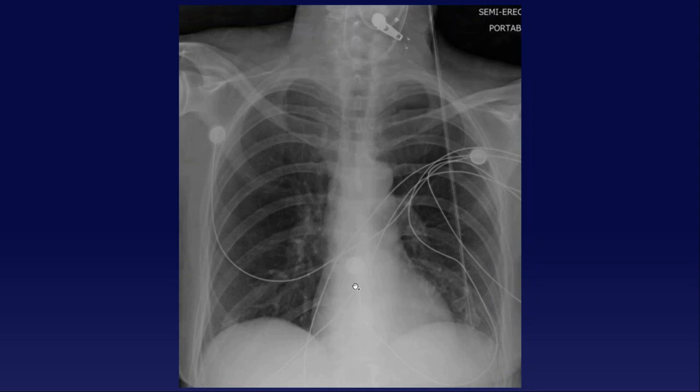Oh, this one's kind of neat. Anyone know what's happening here? Any ideas? Is there an NG tube? Is there a feeding tube? Okay, so there is. Here's the external part of the feeding tube coming up. It goes up over and then it starts curling in the guy's larynx right here. See that? Now this is the zipper from his sweater. They should have taken that off before imaging him, but anyway. So yeah, this is actually a feeding tube coiled in the larynx.